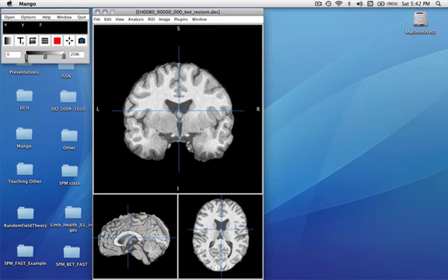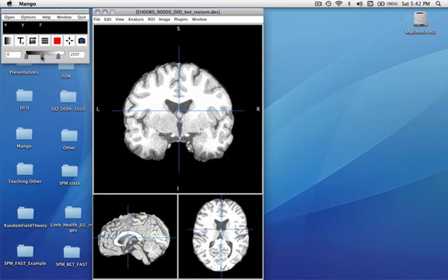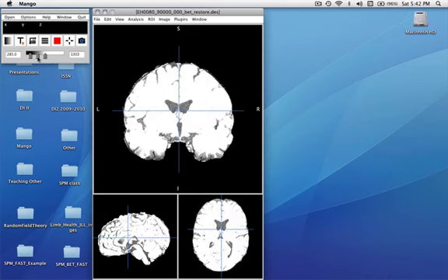There's another feature: if you hold the shift key down and grab one end, it leaves the gray level alone and just changes the range between black and white, which is basically adjusting contrast. As you move this way, it adjusts brightness. If you just grab the middle, though, we're kind of limited in the range.